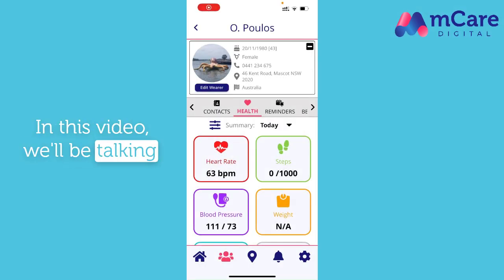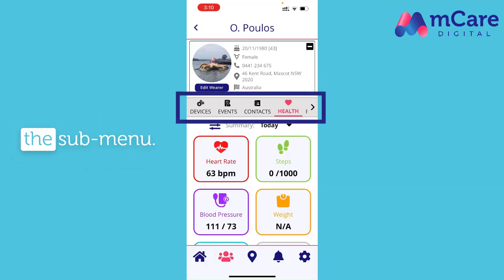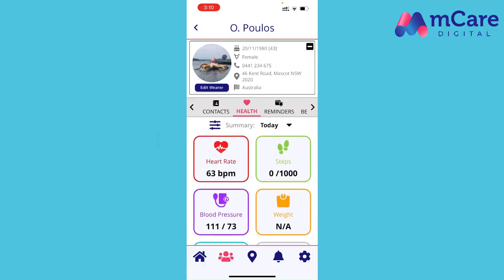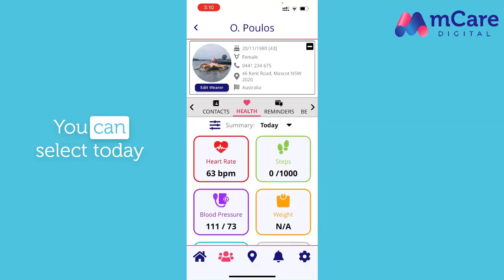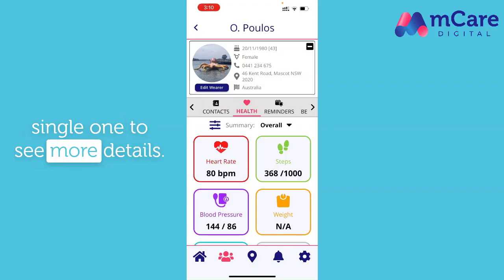In this video, we'll be talking about the health section. You can find this under the devices in the submenu. When you select the health, you will have an outline of the following: the heart rate, the steps, the blood pressure, weight, oximeter, and quality of life. You can select today or an overall reading. You're able to go into every single one to see more details.